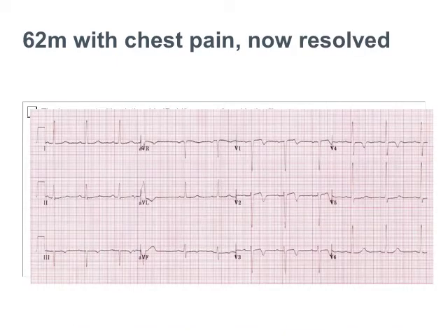All right, so this is a 62-year-old gentleman who had chest pain earlier in the day, was treated at the local hospital, and the pain has resolved, and this is their ECG.